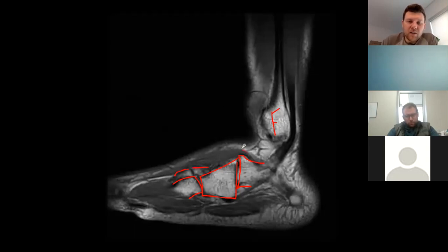What muscle would this be? It's the only muscle we haven't really talked about so far. It would be one of the extensor brevises, and since we're more lateral, probably extensor digitorum brevis. Yeah, we also know that's the only muscle on the dorsum of the foot, right? Mm-hmm. Everything else is extrinsic besides your interossei, which are technically considered plantar muscles. So any dorsal musculature right there is going to be your EDB.